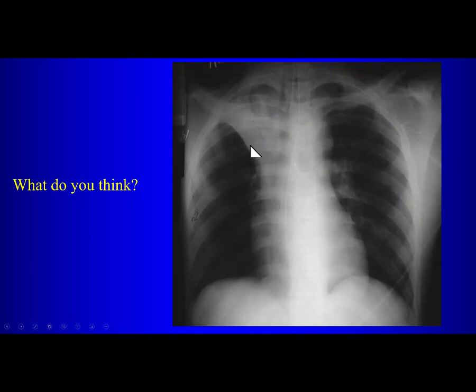No. So this is a case of right upper lobe collapse. Now, could there be an endobronchial lesion? Yeah, there could be, but it's not the S sign of Golden. Okay? So the features of right upper lobe collapse on the chest radiograph are, how do we recognize it? Elevation of the right diaphragm. Is this diaphragm elevated? No. Superior displacement of the minor fissure, opacity in the region of the right upper lobe here, the trachea is shifted over, which you can see. A very good sign on the chest radiograph of volume loss in the upper lobes, whether it's the right or the left, is what? Tracheal deviation. Besides that.